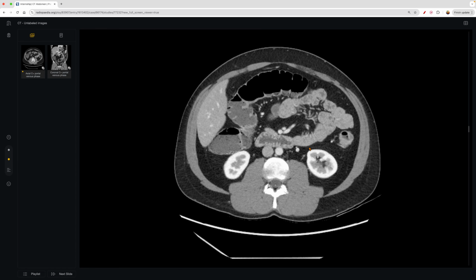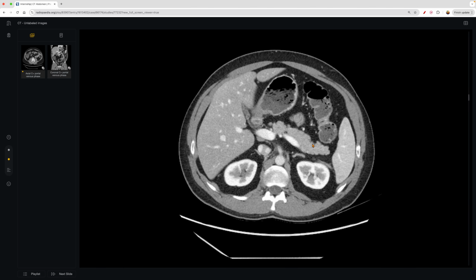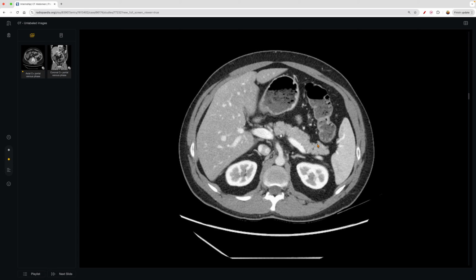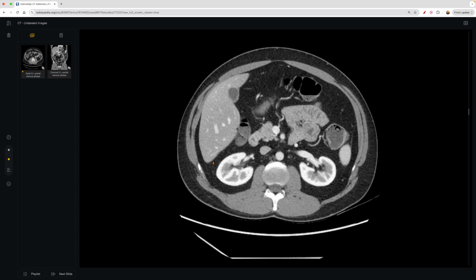If we try to find it here, we go up, and then we can see the pancreas has a very distinct look. Again, to me, I always thought it looked like adipose tissue. If you were to do a live dissection, you can get that very lumpy appearance, and that's very normal there. And so that is important.